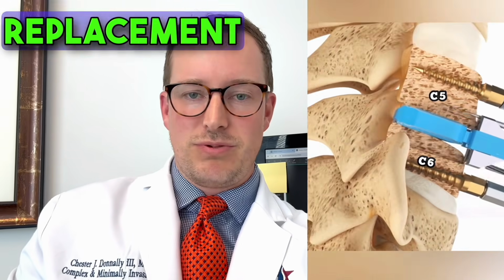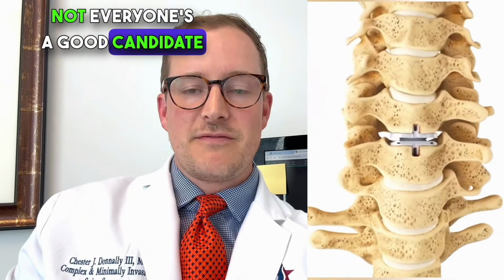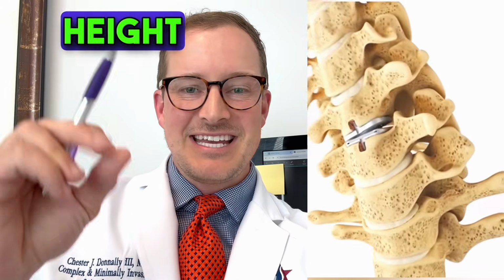For this pathology here, I have other videos that I've already put up on different platforms that show that this patient failed conservative management and had a 2-level cervical disc replacement. Not everyone's a good candidate for a disc replacement. You need to look at the disc height, the stability, and if they failed non-surgical treatment options, which this patient met all those. She's more than 1 year out from surgery and she's doing fantastic.